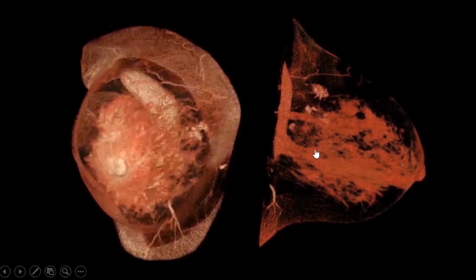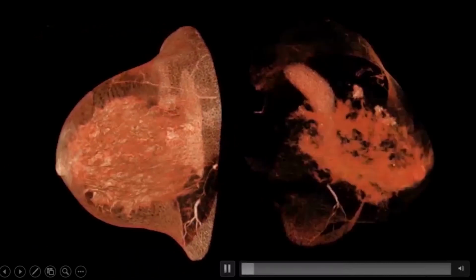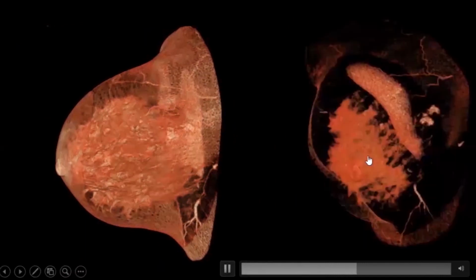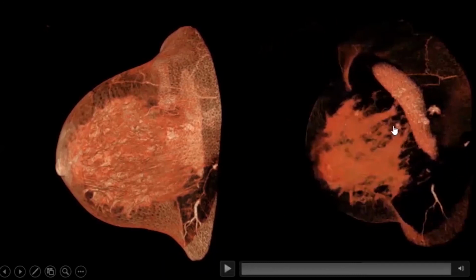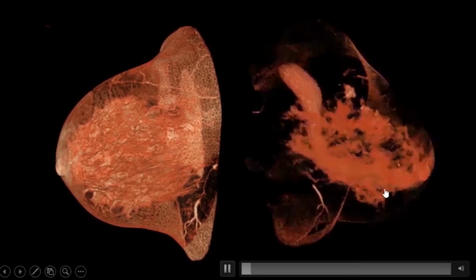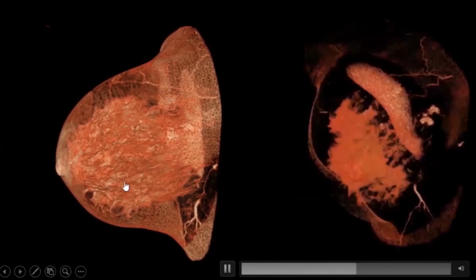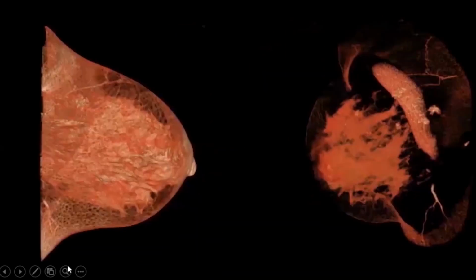What I can show you now is a 3D imaging of the breast with the multiple tumor manifestations in this breast. And you see clearly the size. You can see clearly the relation between those tumors. And at last you see a fourth location, which is right behind the nipple in front of the chest wall. Maybe we would have lost this information without the mammo-CT. And these images are absolutely astonishing. And I think it's really the next step in senological imaging.